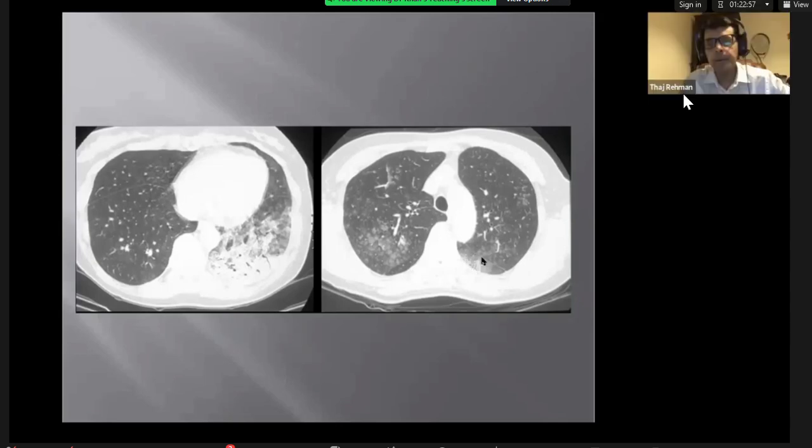Right. I mean, this is interstitial thickening. Okay. So there is ground glass opacity, which is an alveolar acinar process. In addition, there is interstitial thickening, as you can see, thickening of the interlobular pulmonary septa. When these things both happen together, that pattern is called?